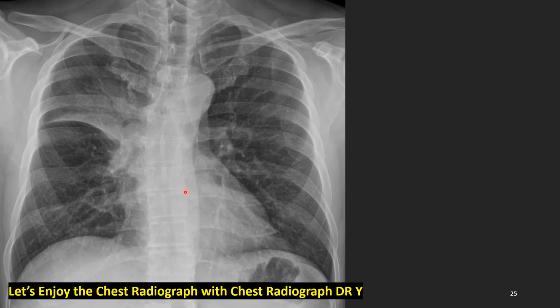This is the last case of this session, and I hope you pay more attention to this patient. Just looking like right upper lobe pneumonia, with a bulging fissure sign, air bronchograms, and consolidation. But she doesn't have many respiratory symptoms, not like pneumonia. Not much cough, not much sputum. So it's very complicated. At first glance, we used to say that this is right upper lobe pneumonia, alveolar pneumonia, with a bulging fissure sign. But this isn't true.